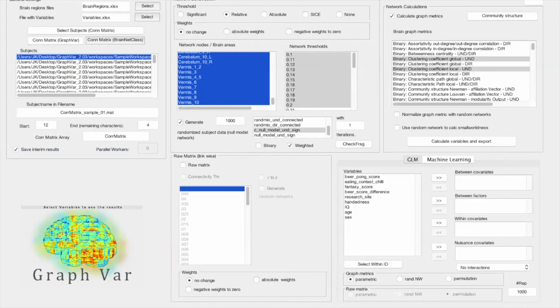So don't get too sad or lost when it stops working if you see an error when you only want to export those values, because they are already calculated, and it might just in some circumstances be the export function not being able to write it in a CSV or in an Excel sheet. But you have it in the specific interim results folder, everything saved.